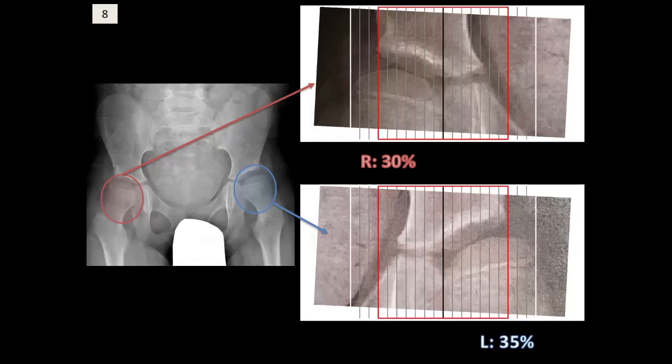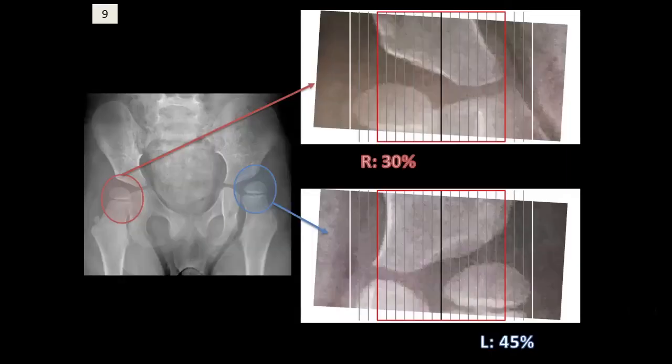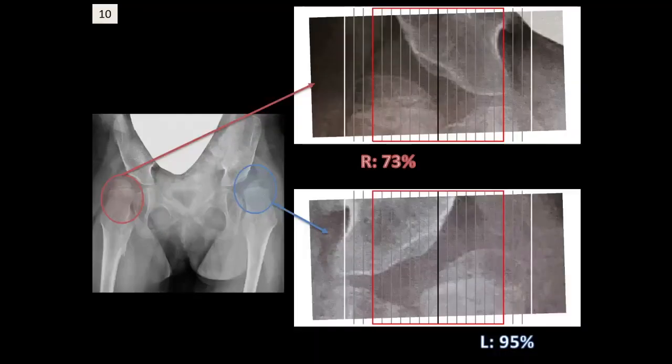And the suggested answers to image 8. X-ray number 9. And the answers to X-ray number 9. And finally, X-ray number 10. And the answers to X-ray number 10.